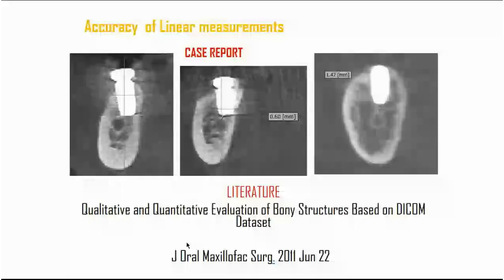In the beginning, we would like to see what actually was the result of our surgery. And on these pictures, you could see the implant of 6 or 8 millimeters, where you cannot measure, or you can measure half a millimeter distance from the mandibular canal, or 1.5 millimeter distance from the mandibular canal. And some of the people could argue that this should not be advice for regular clinical actions, and I can tell that they are right. But sometimes we need some actions.